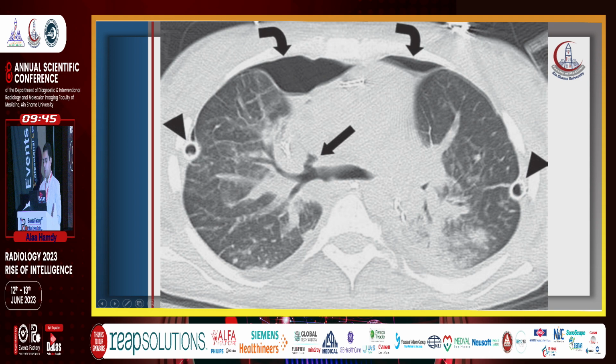In this case, we have a 28-year-old woman, 11 days after lung transplantation, who developed persistent bilateral intractable pneumothorax in spite of the chest tube inserted bilaterally. However, it has recurrent pneumothorax. The cause was revealed on CT.